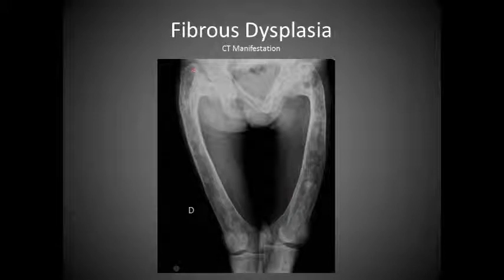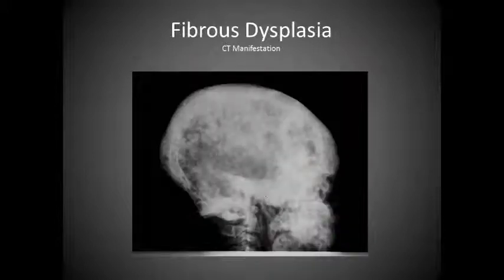So here we see what it looks like on just plain X-ray, being sclerotic. It just has all of these areas where there's lack of density all the way through, and we would say that, well, this patient has osteoporosis. However, look at how old the patient is. Also notice how the femoral neck is angled in an entirely opposite direction. And notice how you have ballooning of the leg.